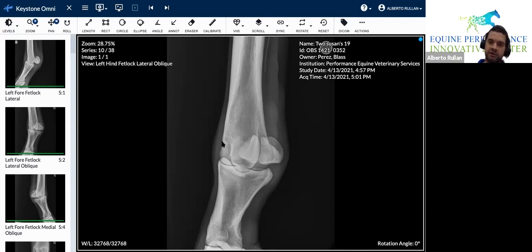I go cannon bone. This is the epicondyle, right? Epicondyle. Then I go on the condyle right here of the cannon bone. Then another condyle. Then I go up and I read the splint bone. Then I go on the sesamoid: articular surface of the sesamoid right here, apex of the sesamoid, abaxial surface of the sesamoid, base of the sesamoid.